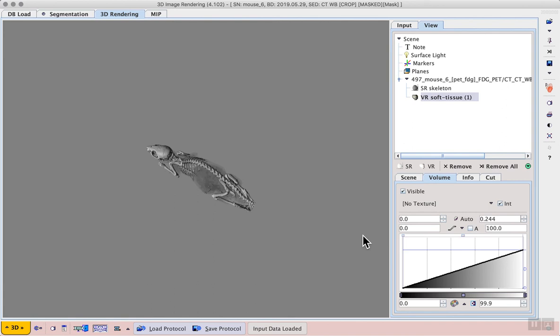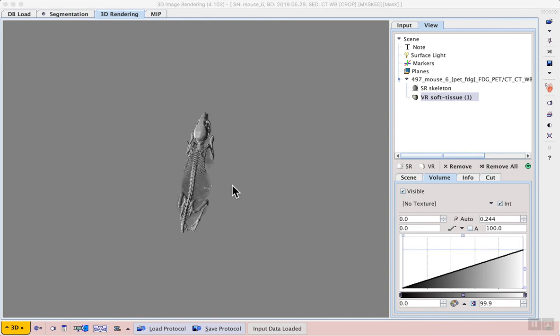And following this, we might render a VOI highlighting some feature of our image. In that case, we can explore the image by rotating using the mouse. And our goal will be to locate the lesion on the right hand side of the chest.